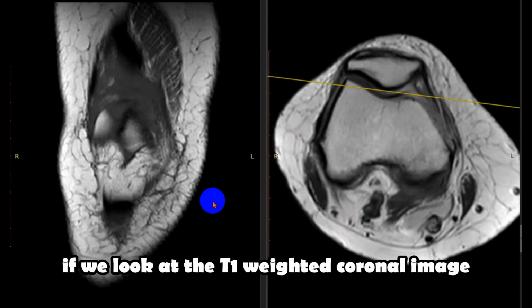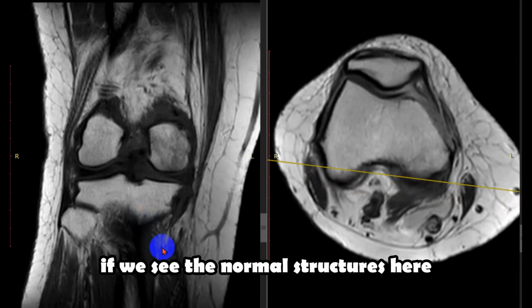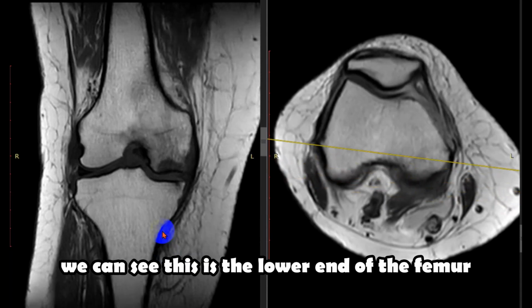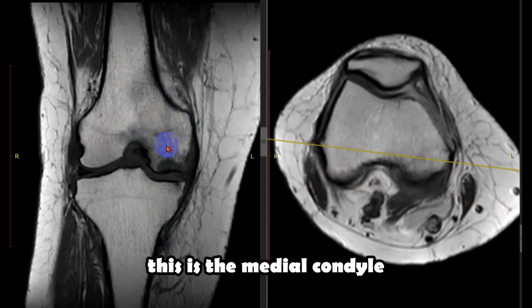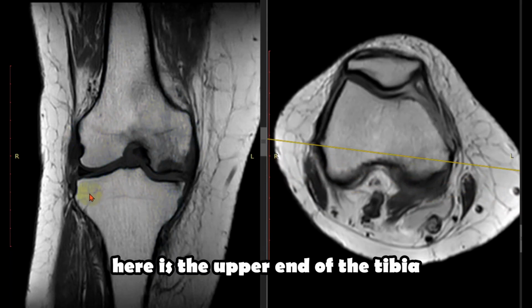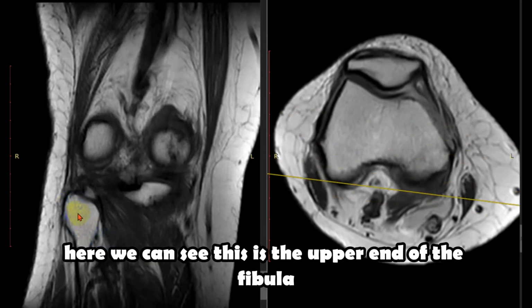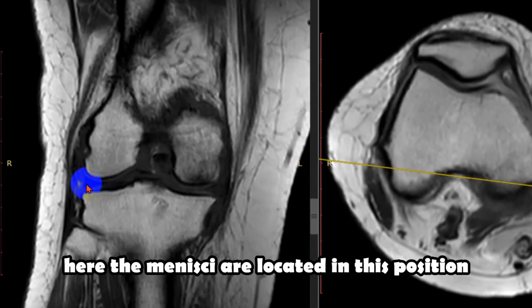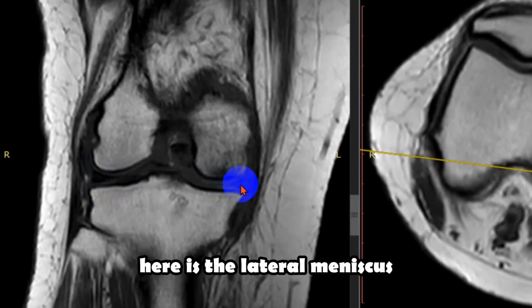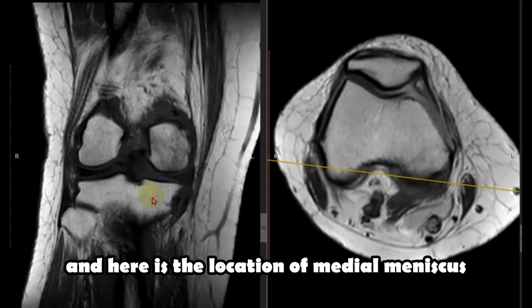If we look at the T1 weighted coronal image, if we see the normal structures, here we can see this is the lower end of the femur, this is the lateral condyle of femur, this is the medial condyle, here is the upper end of the tibia, here we can see this is the upper end of the fibula. Here the meniscuses are located in this position. Here is the lateral meniscus and here is the location of medial meniscus.